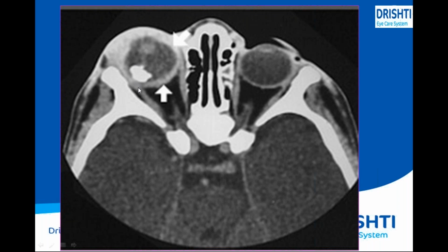If you see, the choroid portion is not so much involved. In choroidal melanoma, it extended all the way till the sclera, but this one, if you see, has extended from the retinal portion. So this is the retinoblastoma case, and this is the extension of the mass. While doing the operation, if it is not involved in the posterior surface, the mass can simply be removed. But when there is extension, the total eyeball has to be removed, which is called enucleation.